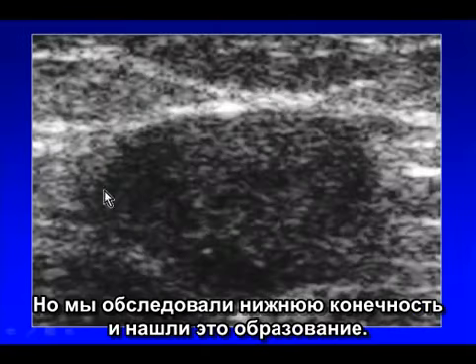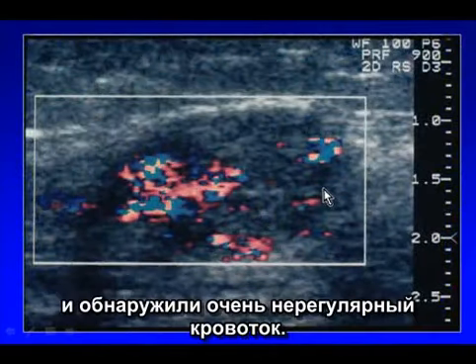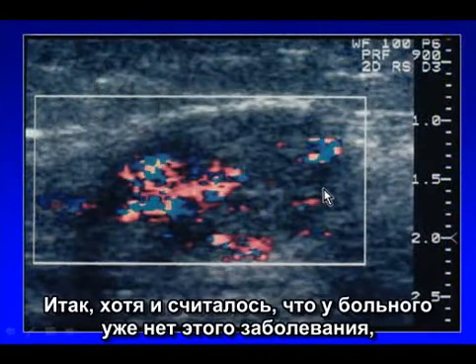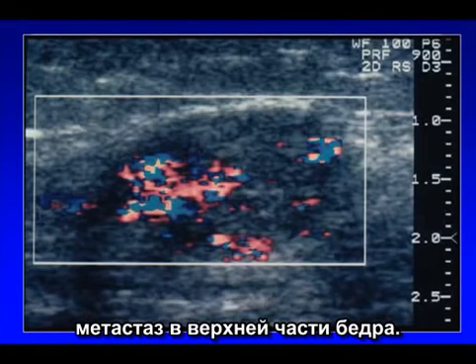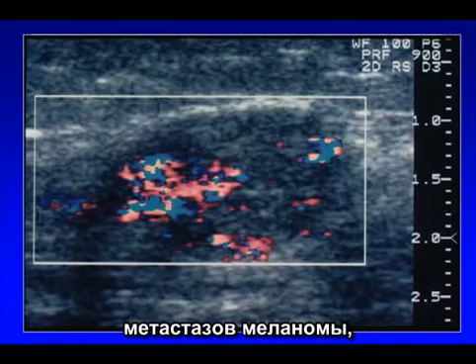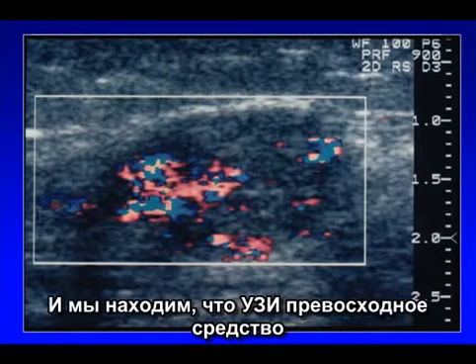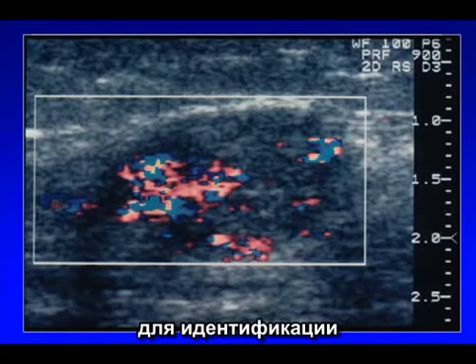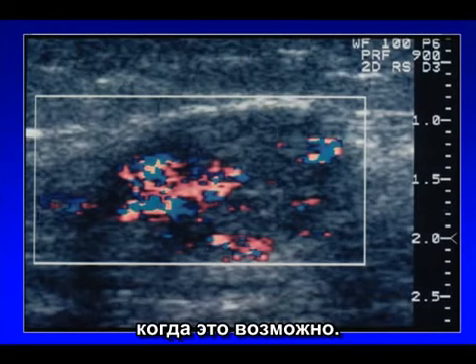He was clinically free of disease when he came in a few months later, but we did a survey of the lower extremity and we found this lesion. We put the Doppler on it and it had very irregular flow. So he was thought to be free of disease at this point, but in fact had a pretty good sized metastasis in his upper thigh. So when patients are at high risk for melanoma metastasis, if they have a very deep lesion, one that's high risk for spread, we have found that ultrasound is an excellent tool to identify melanoma metastases and then, of course, to guide biopsy if possible.